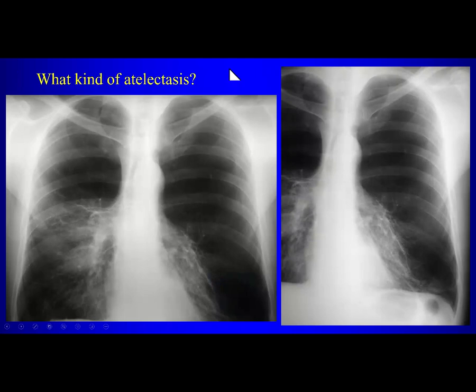So is there volume loss on the chest radiograph here within one of the lobes? Or more than one of the lobes? What do you think all this opacity is over here? Is that a pneumonia, or could that be something else? What about this opacity here? So a large bullae. Okay, so the patient has large bullae, all right?